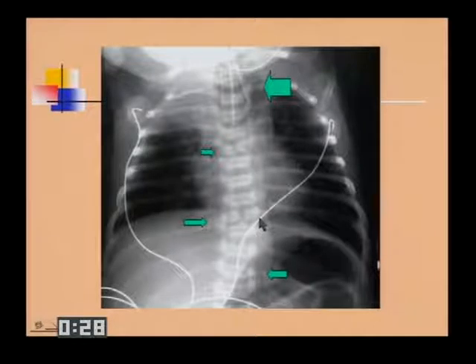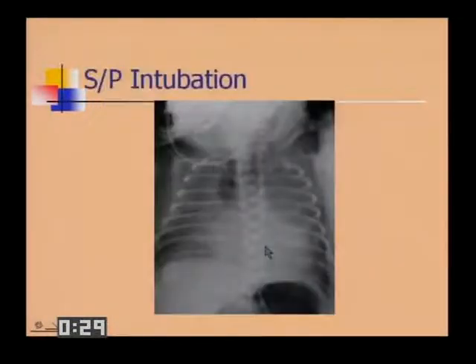In this case, because you've got the esophagus ending here and the air distally, you know you have the most common form of esophageal atresia, where the trachea has given off a fistula to the stomach, and that's the most common kind, seen in about 80 to 85% of patients with esophageal atresia. This child has also been intubated and has a very peculiar gas collection. In this instance, you do have an abnormal collection of gas due to a traumatic intubation.